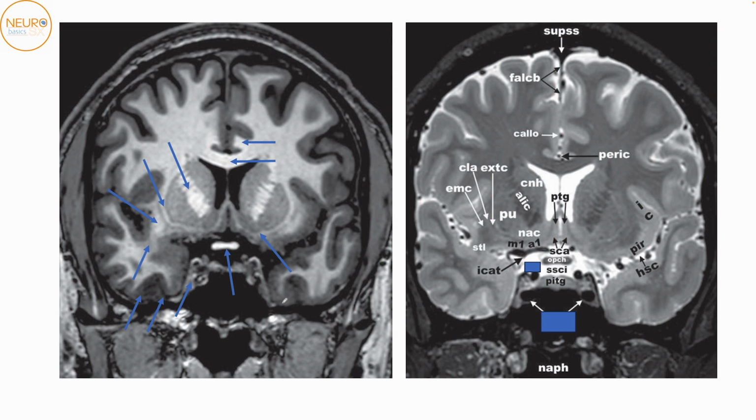Okay, as we go further deep, we can see that this is the optic chiasm, which is formed by the optic nerves over here. Optic chiasm is quite often seen on T2 imaging also. Apart from that, we have the corpus callosum. We have the cingulate gyrus, the cingulate sulcus on both sides, the ACAs that we have already picked up. You have the caudate forming the lateral wall border of the frontal horns, the septum pellucidum, the anterior pillars of the fornix running over here. Okay. Then you have the putamen, the nucleus accumbens on both sides over here.